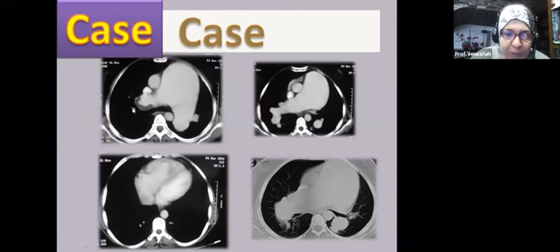And here we also have, in the first image, what looks like thickening of the wall. Thickening of the wall, as I said, represents chronic thrombosis. These very large central arteries are seen in cases of bilharzia cor pulmonale and in atrial septal defect. But in bilharzia cor pulmonale, the heart is not markedly enlarged, while in atrial septal defect, the heart is usually markedly enlarged. So if you look here at the heart, only the right side is enlarged. There is no significant cardiomegaly.